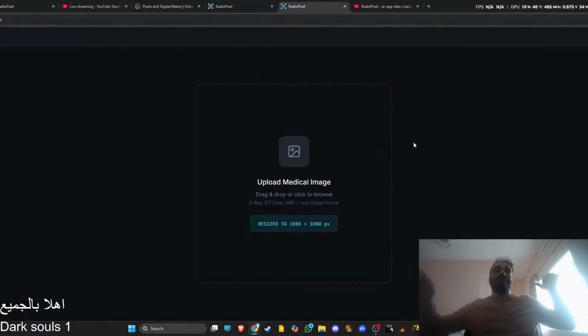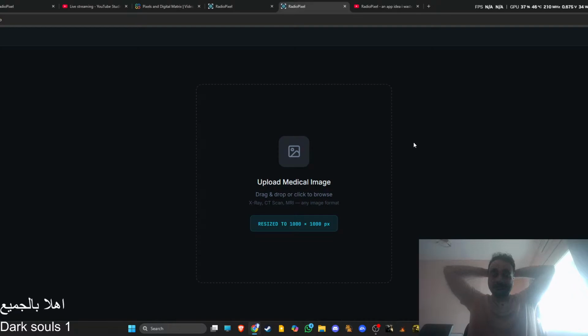Showcase my small app. I don't know how good it is. No, actually, I know how bad it is, but it's just working. I spent so much time on it, so maybe I will showcase it. I will get some feedback if somebody sees it. I just feel disappointed, but let's just showcase it.